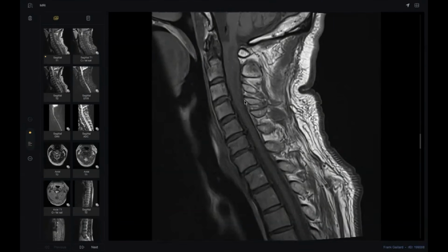It shows slight internal areas of hypointensity. There is no definitive extradural extension in this image. The bone marrow signal appears slightly altered in the adjacent vertebrae. No abnormal high signal to suggest internal bleeding or fat.